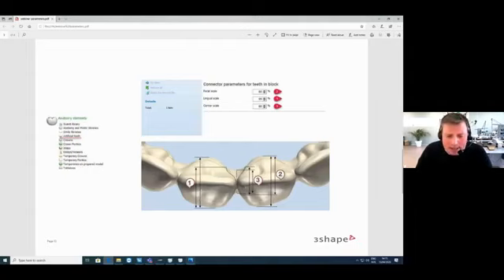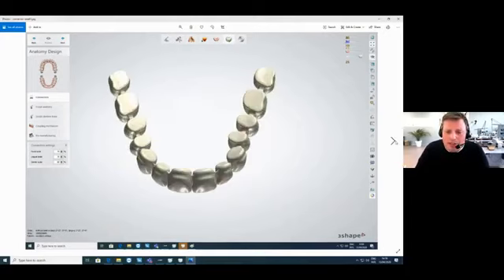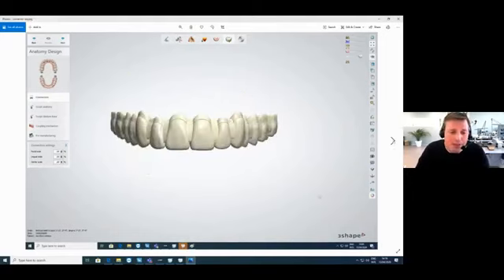So I did some extremes. I always like to put them on the lowest range. There is a limit on it, so you will see this is the limit, 70, 70, 60%, but it's enough for a straight arch, and that's the most aesthetic solution. I will show you what happens at the low setting, but you can also set it to 100% and you will see what changes.